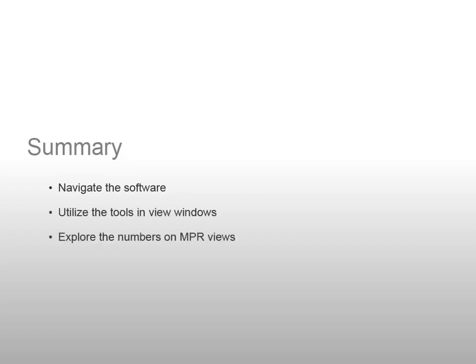Now you should be able to navigate the software, utilize tools in the view windows, explore the numbers on the MPR views, and manage adjustments.